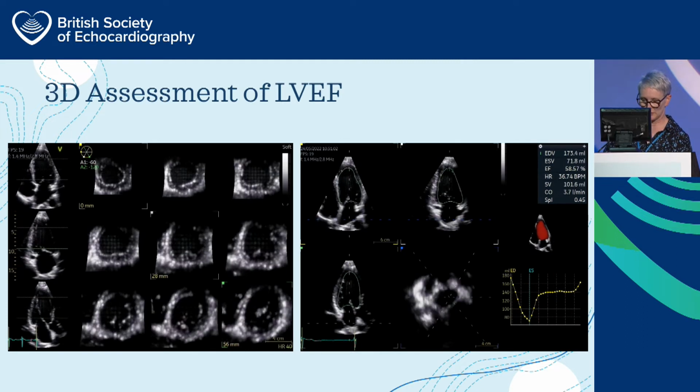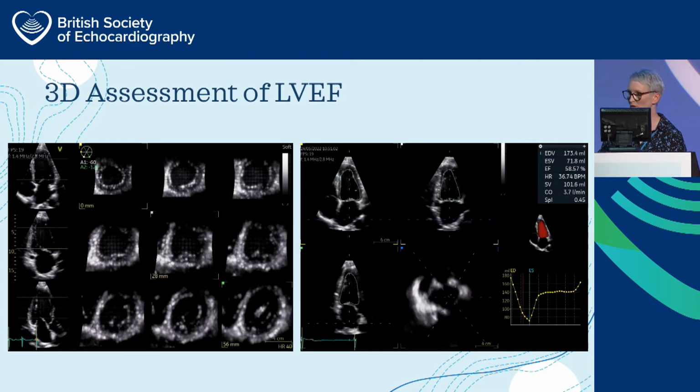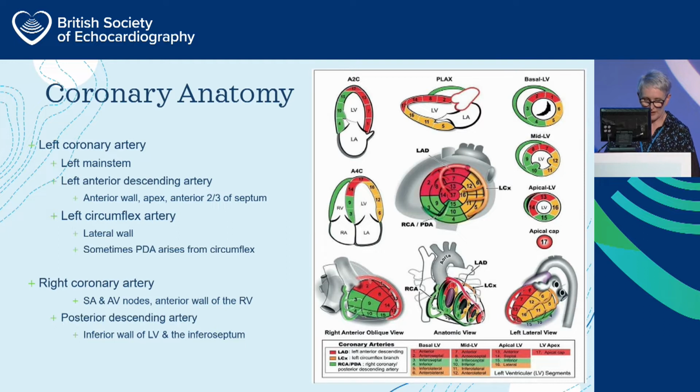Again, it's a semi-automated measurement, so that makes it really quite reproducible between operators. Have a go. So we've talked a little bit about ejection fraction and global assessment, therefore, of left ventricular function. So let's think a little bit about regional assessment.